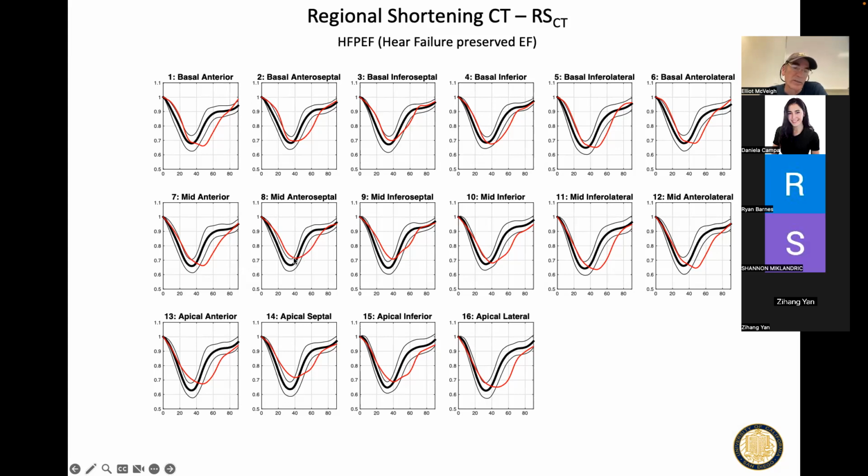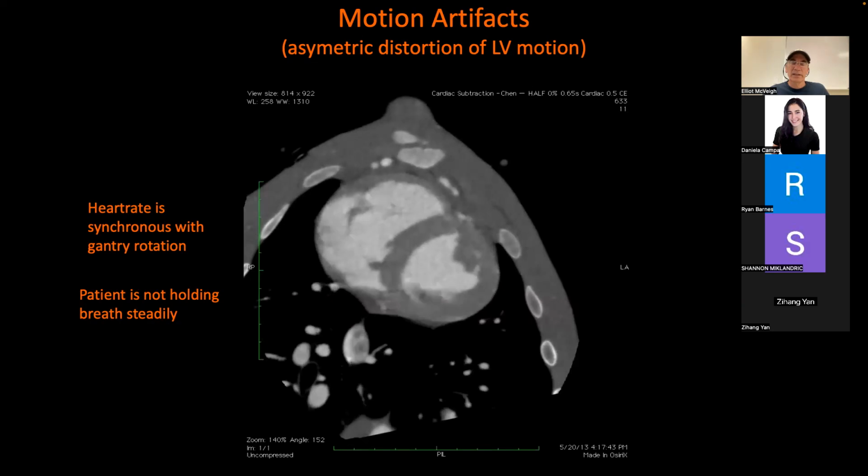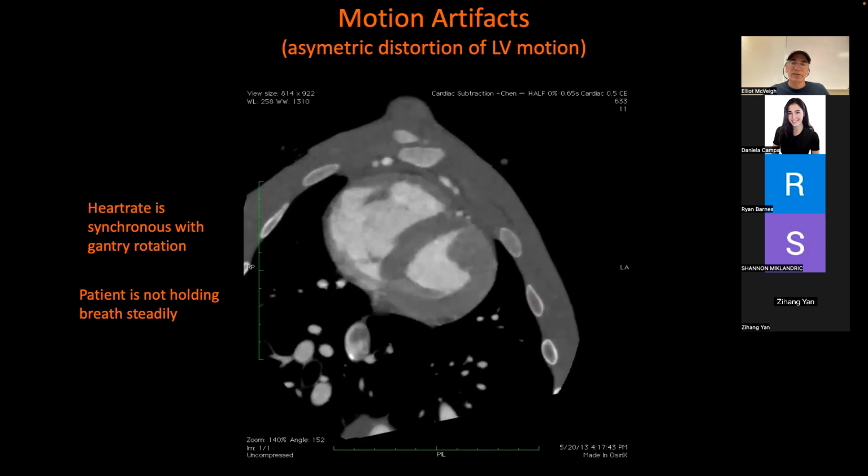And then what also is slowed down is its ability to relax. And so it becomes more like a squeeze box kind of function. This is sinusoidal squeeze box as opposed to a normal LV contraction, which has rapid contraction, rapid relaxation, and then rest. That's how that usually goes. So when you see something like this, you know this person has delayed relaxation and slower relaxation than normal. So those are the fine structure.